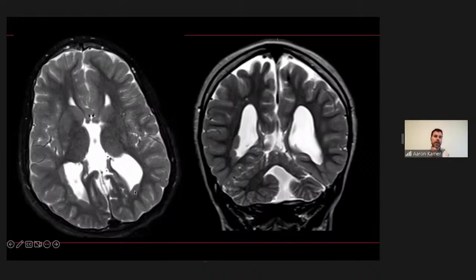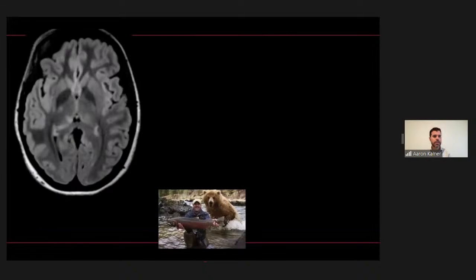And in fact, Wyatt, when I was staffing with Wyatt just yesterday, we had a case where there were some nodules a little bit separated from the ventricle that matched cortex, that matched gray matter on each sequence, that we suggested maybe could be gray matter heterotopia as well. But Wyatt, especially for your information, this is what it more typically looks like, as Chris was describing, right along the ventricles like this. Nicely done. Okay, so we'll do, let's see.